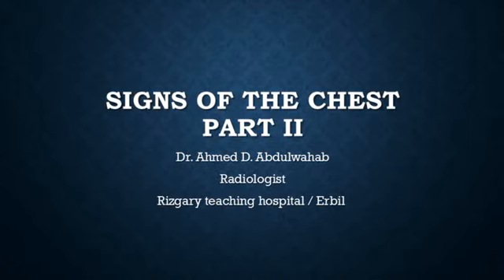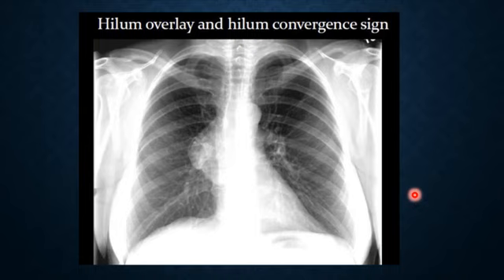Okay, good morning. Today we will continue with our presentation on the signs of the chest. Today will be part 2. First, let's see this sign and what it means: the hilum overlay sign and the hilum convergence sign.